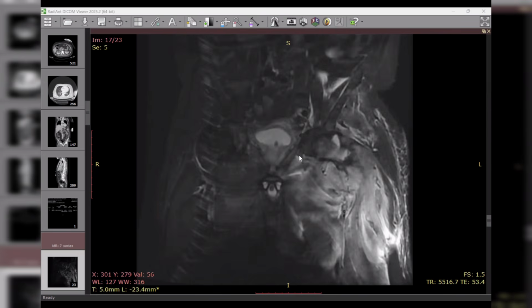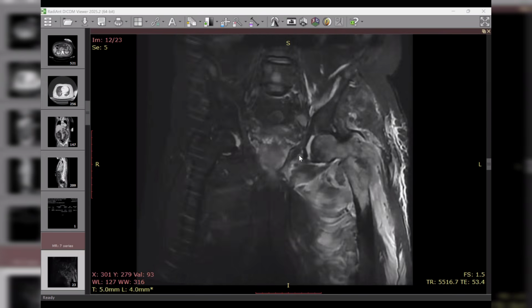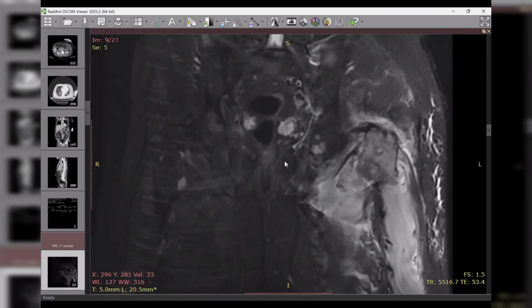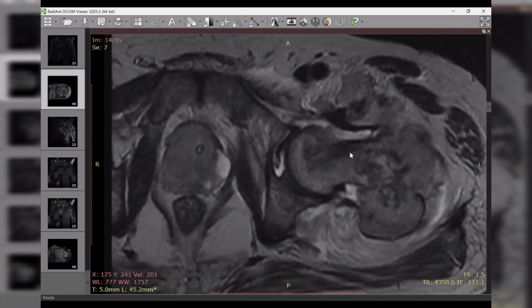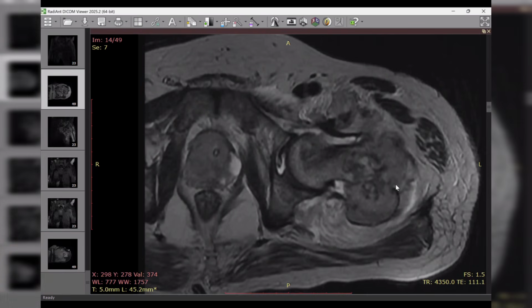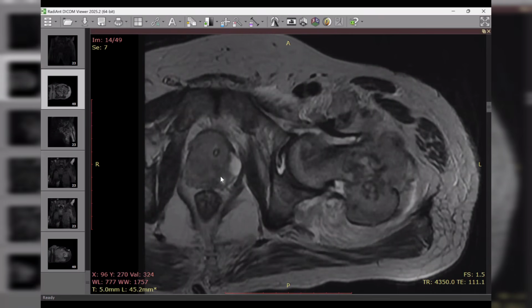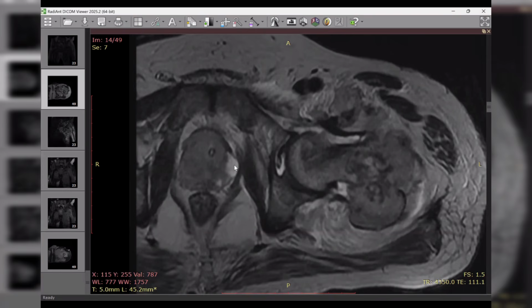Look for the remaining pelvic bone. Then after that, look for the T2. Already this is a male patient, so the primary impression will be the prostate. So look immediately for the prostate, either in the field or even out of field. If you are lucky and you see it in the field, look immediately at the peripheral zones and the transitional zones. Then look for the lymph nodes.